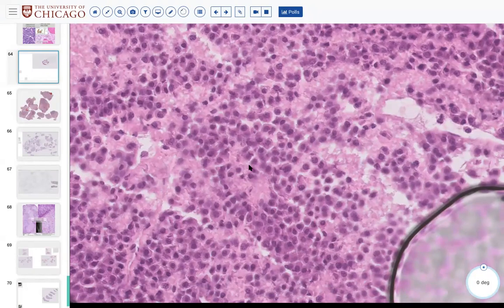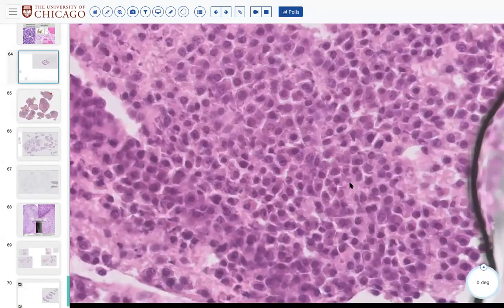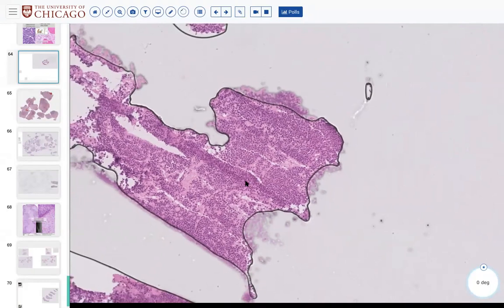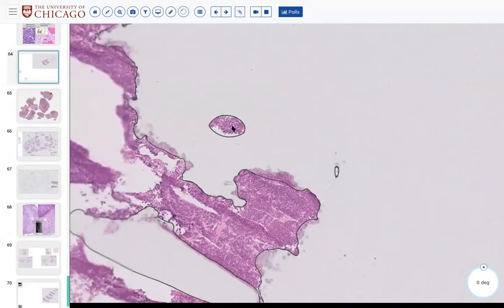Right, like a solitary plasmacytoma. More often than not, however, these patients do have diffuse osseous lesions with serum proteins. In that case, it would be multiple myeloma, but always clinical and radiographic correlation is needed. Exactly. So plasma cell neoplasm is a good way to cover all bases, whether it's a solitary plasmacytoma or a true multiple myeloma.